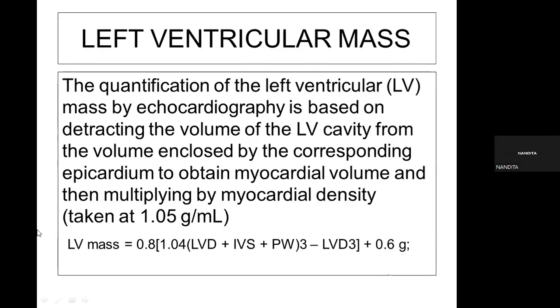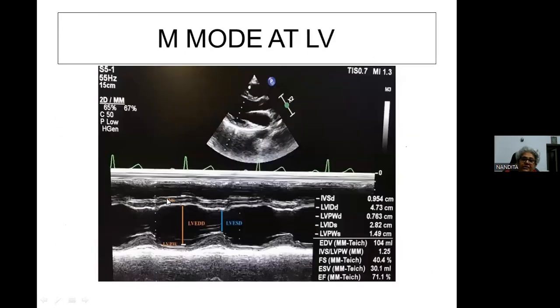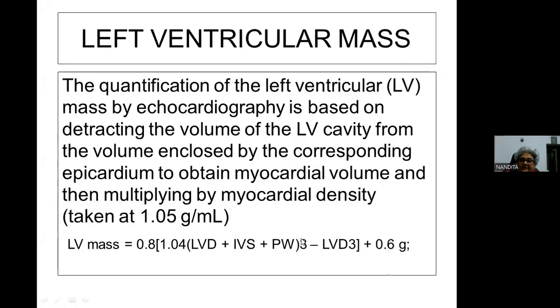No. We had actually included this. All you need to do is measure this. You have measured the IVS and LV, so the machine does the rest. It will calculate the LV mass and give it to you on a platter. So you just report it.